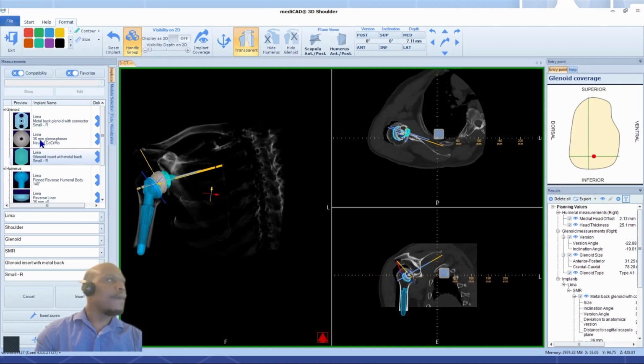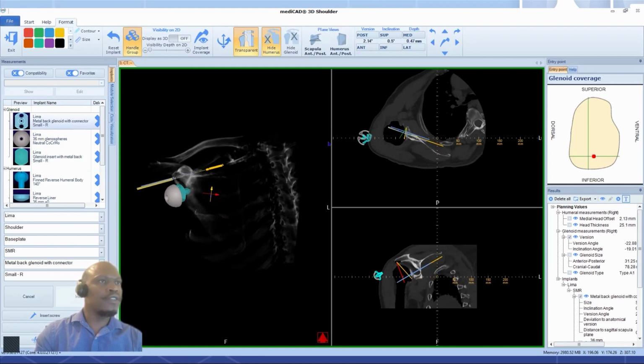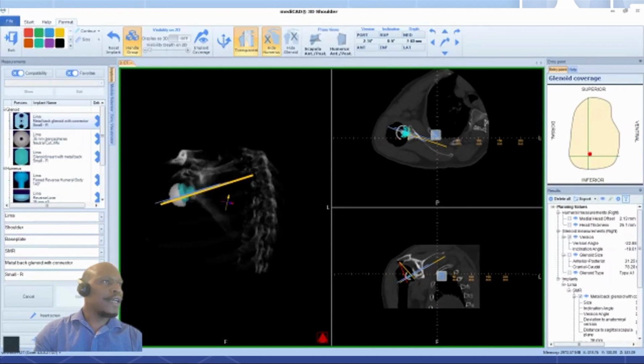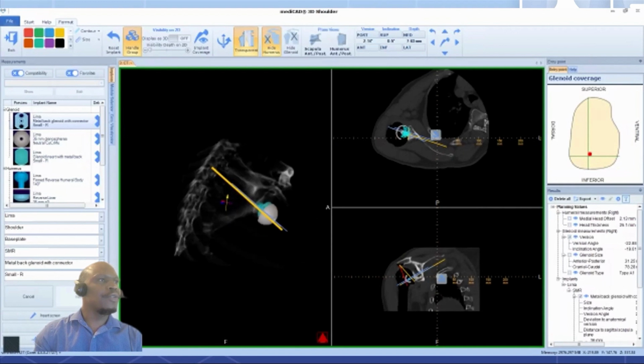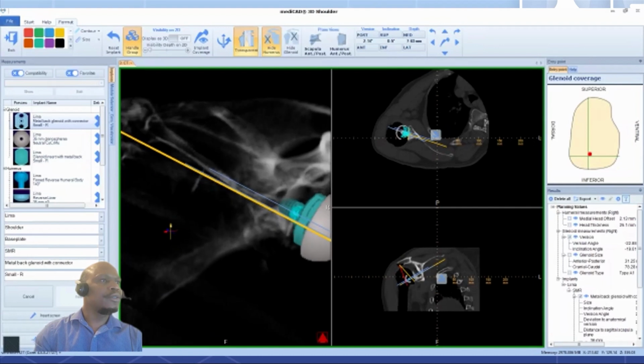With the CT, if you select the component, you can use this, which is basically the angle. You can change the angle, you can move it in different directions to put it in the proper position if it is not seated correctly or if it is not positioned properly. You can use the CT to go to different slices to see every angle on it. And then also you can use the 3D to move it around, zoom in and zoom out to see the component.